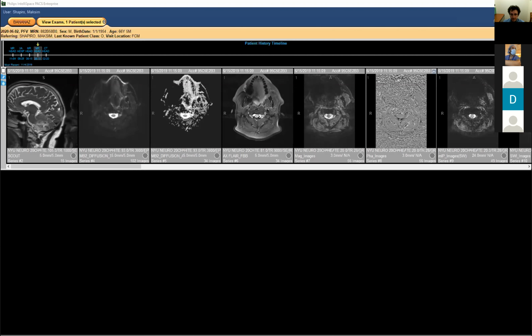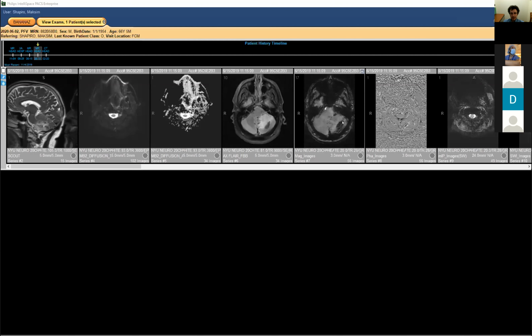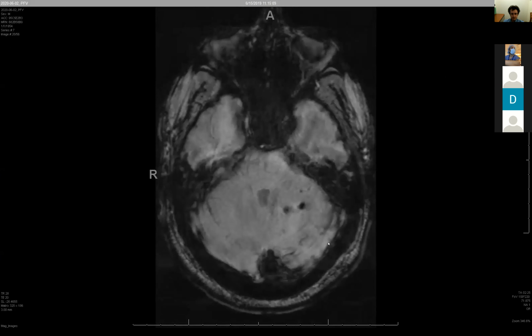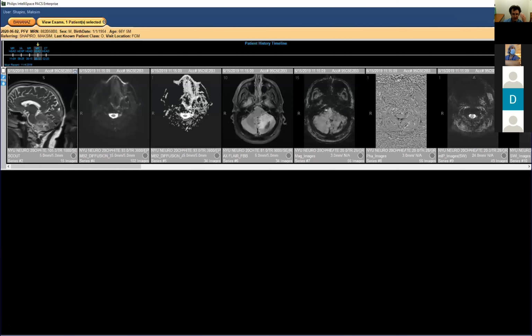All right. So again, this is a patient that comes in months later following this kind of hemorrhage here. You see the residua. This came to us by way of a previous treatment at a different place.